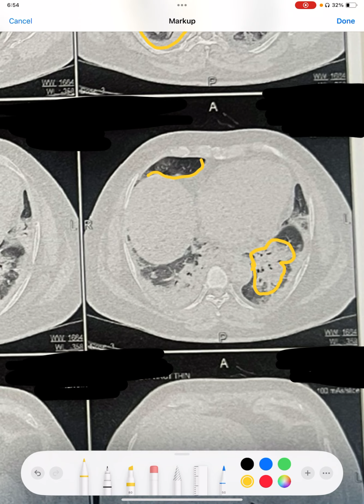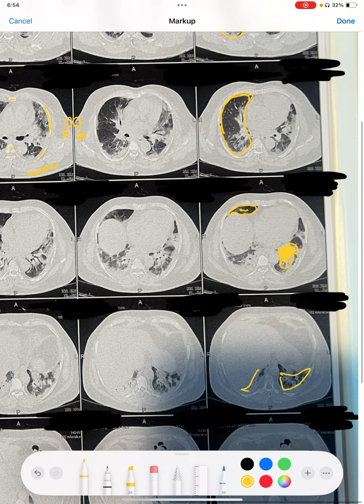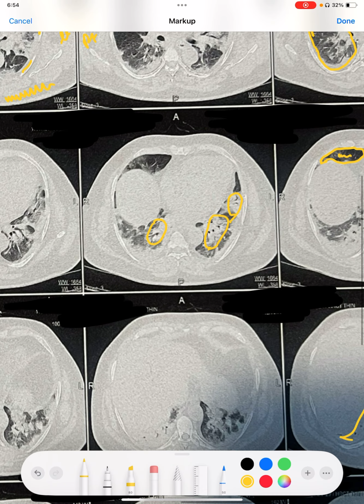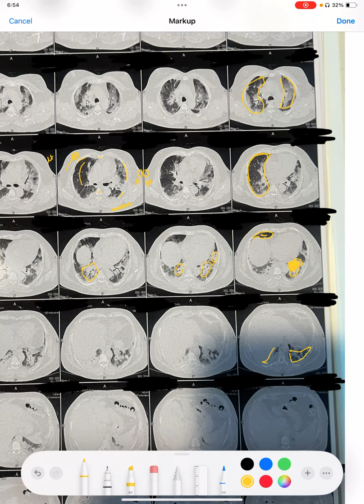So this is a normal looking lung. So actually lung should look like this, but this is very much homogeneous. So presence of a homogeneous patch on the normal looking radiolucent lung is what is pneumonia. So what we very easily can see, these are all patches which are present in this left lung as well as on the right lung. If we can see here, it is the right lung and we can very easily see patches.